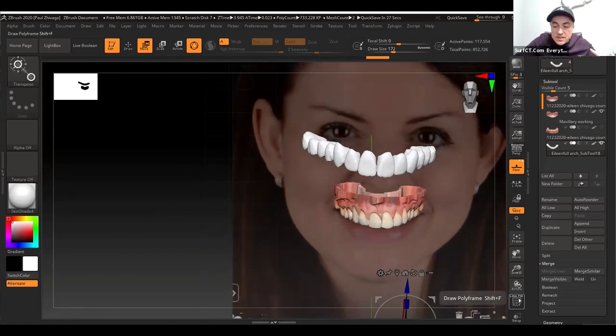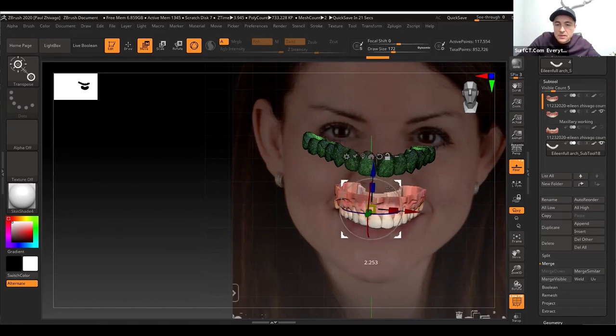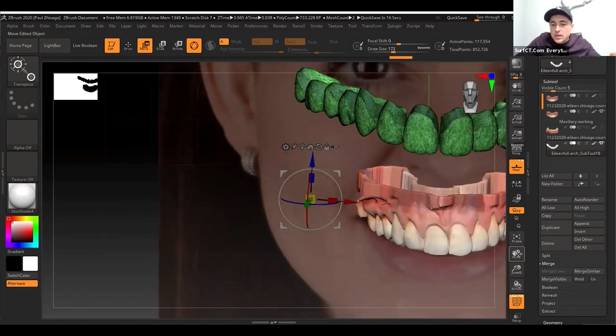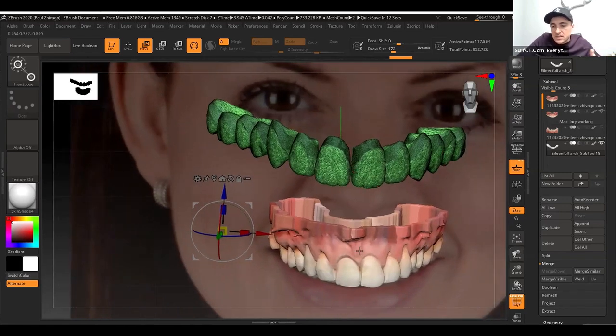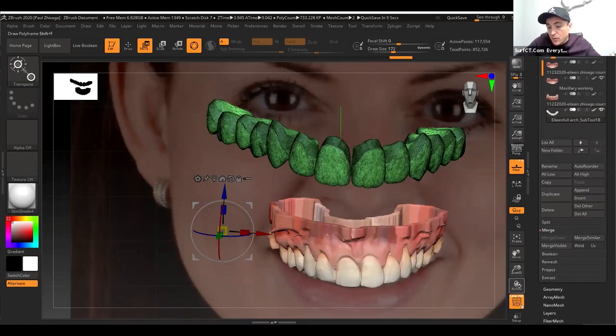that shows us basically where the grid size is and how the resolution is. So if you click this on, let me just bring this a little bit closer here. Okay, so you will see that your arch that you imported has one color, is subdivided in certain triangles and quads. And this is the information that the polyframe grid will give you.